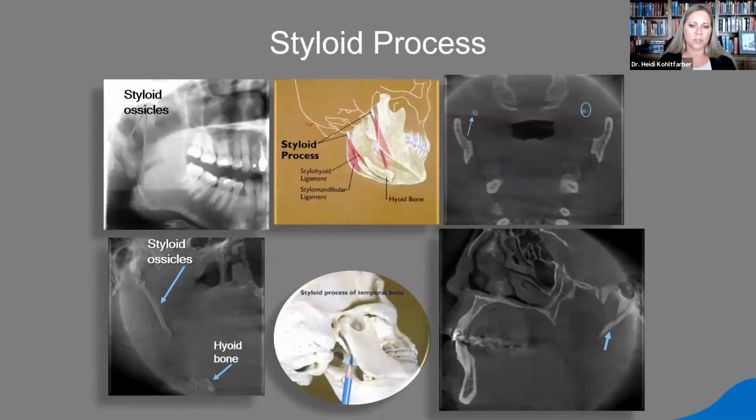So let's first talk a little bit about our styloid process when we are reviewing our scans. One of the things you'll notice, here's the airway space. This patient, the nose is down. Posterior and lateral to the airway space, we have a calcification. Now, it's the exact same way that we talk about a calcified carotid atheroma. We say it's posterior and lateral to the airway space. So how do I know if I'm looking at the styloid process versus a calcified carotid atheroma?